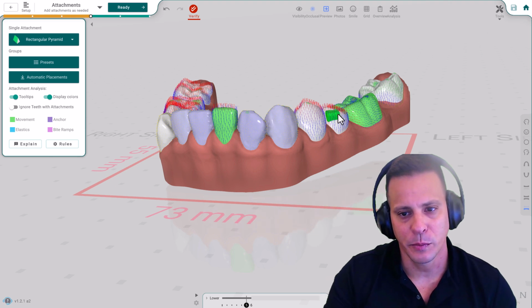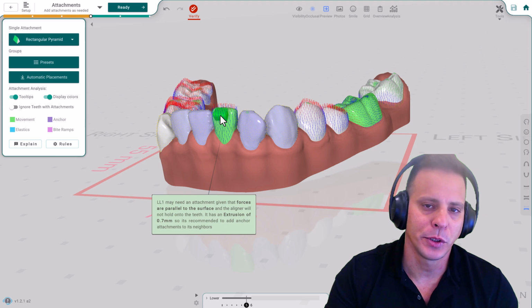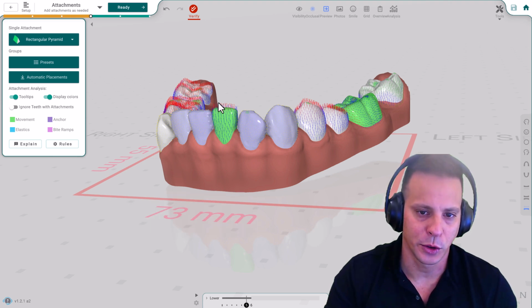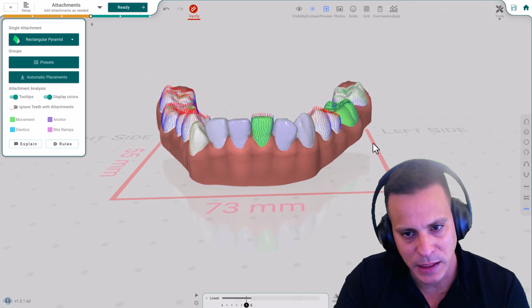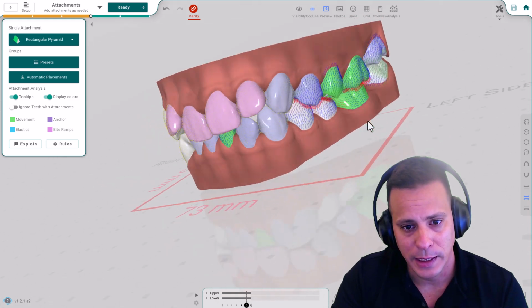If you start making it farther away, placing an anchor in here, it may not produce a correct anchor for this section because the plastic will start to go up and break out of the surface. But yeah, we're giving you these hints very quickly. And we do even more, like in here.